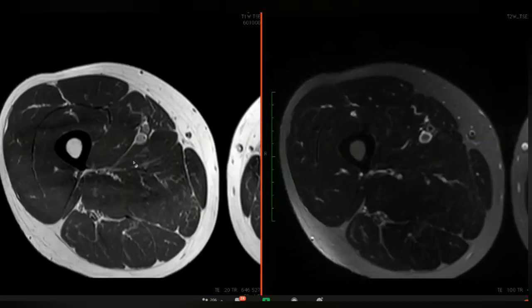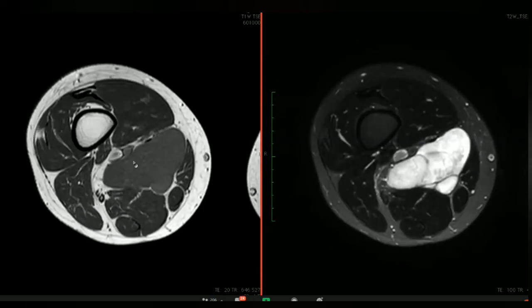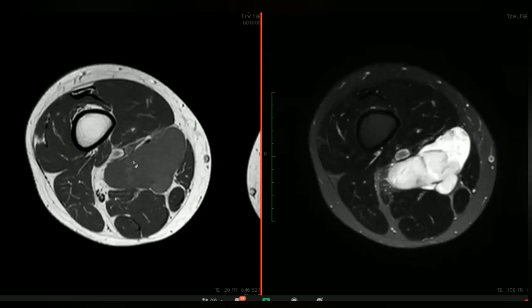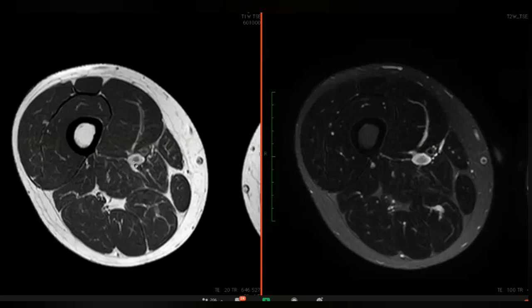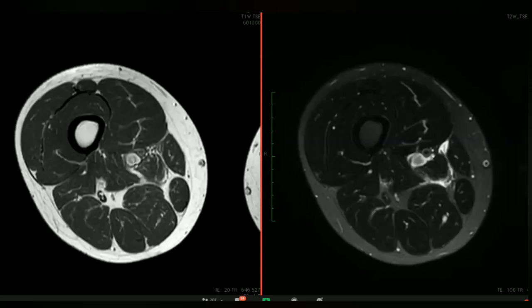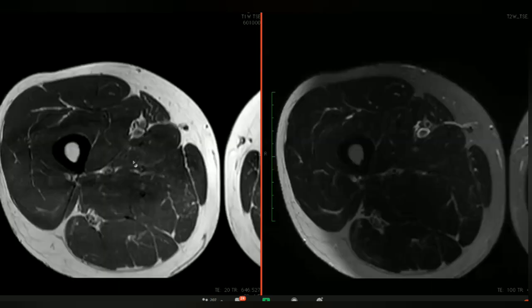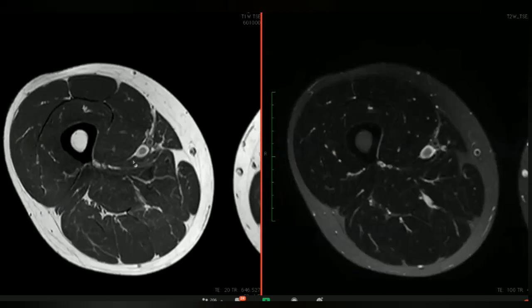Where is it? So you need to describe from a report perspective where it is. Sir, can I move it a little? I can see the location. Sir, it's in the upper thigh. No, no. Sorry, what vessels are these? Sir, it's popliteal. Nope. Popliteal would be behind the knee. This is in the thigh. This is the anterior thigh.